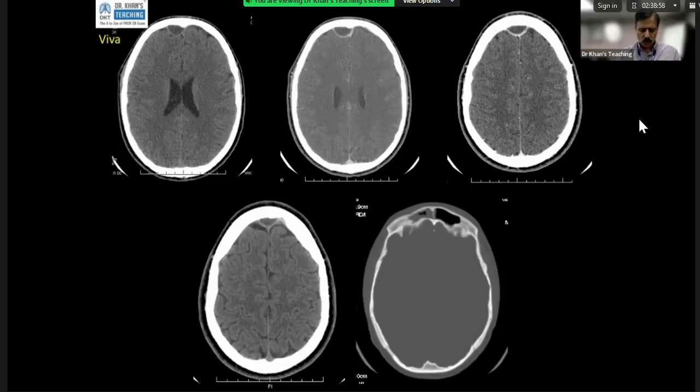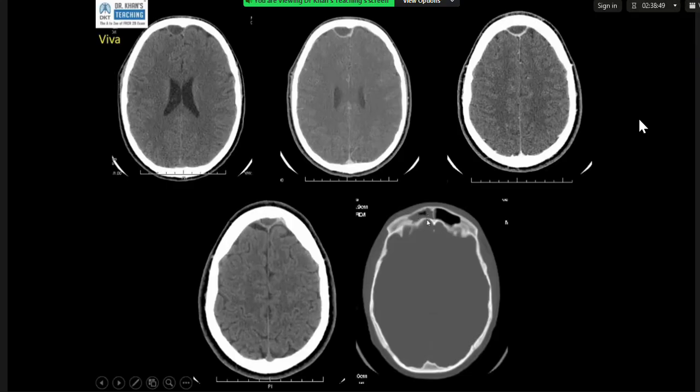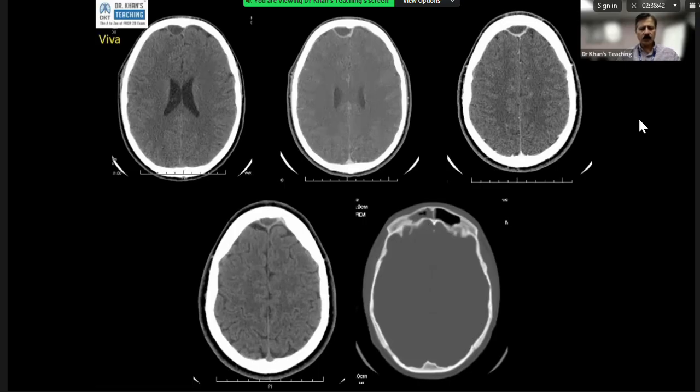Okay, I think you used the word, did you initially use the word maxillary, isn't it? This is sorry, frontal, right frontal sinus, yes. Okay. So in this case, and you use the word subdural, and why isn't it extradural or epidural?